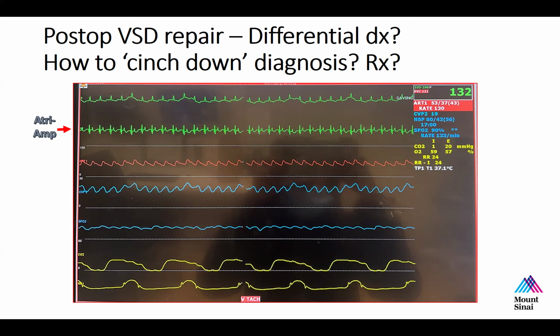One of the things that you notice on this tracing is that the CVP is very high. So that would also be a reason I would treat this, and it was also in my brain as I was looking at this, in terms of whether we should treat somebody who has a CVP that high, which is likely because you have AV dyssynchrony, and would benefit from having AV synchrony.